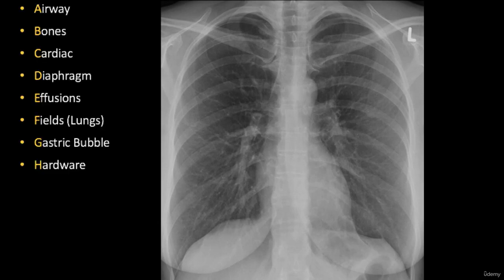It's always easier when you have a plan in front of your eyes. And this algorithm that is usually followed by a radiologist is here on your screen. We look first at the airways, then evaluate the bones, the shadows of the heart, the diaphragm, the domes on the right and on the left. They look at the pathological contents in the costodiaphragmatic recess.